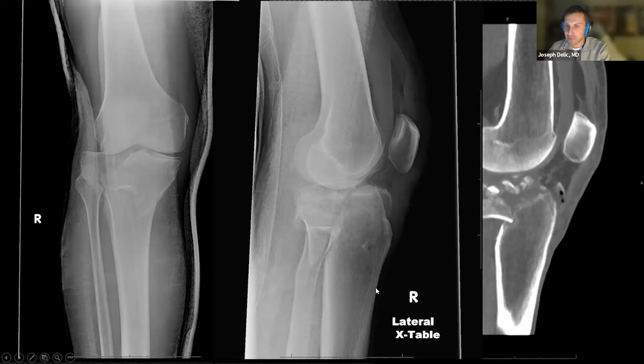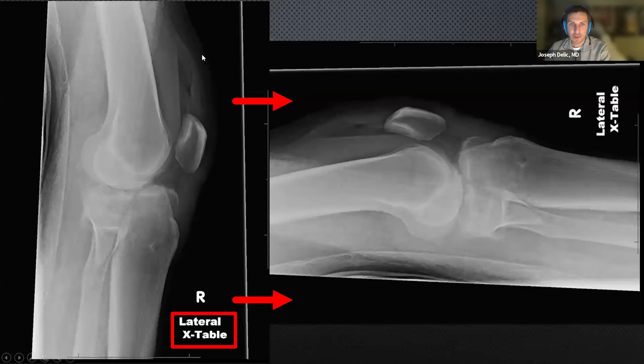But how are these patients usually imaged, right? Well, if you take this image that we had and you flip it, these patients are usually imaged cross table lateral. So they're usually lying down, and that's why your layering is horizontal like this. So you see this vertical layering because that's how the image is presented to you, but this is really the way that the patient is imaged.